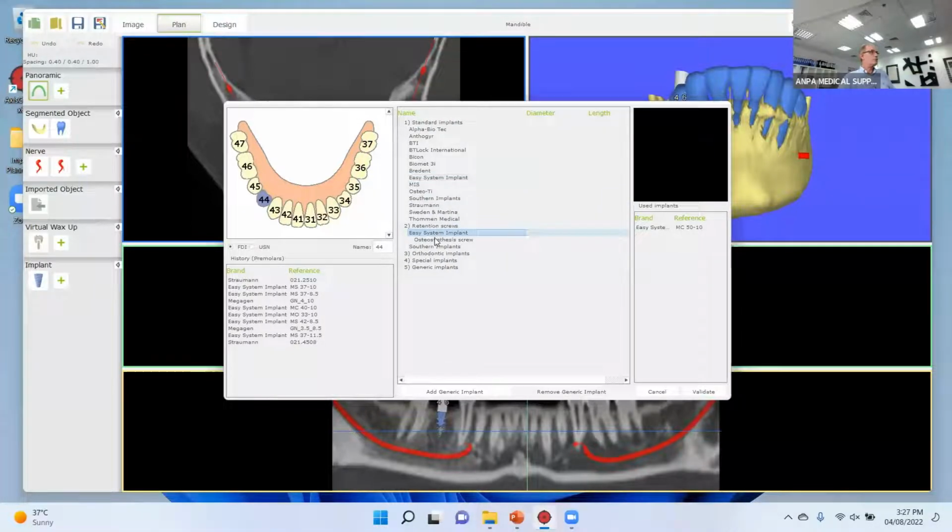So retention screws are important. So you have this kind of retention screw. Retention screws can allow you to stabilize the guide in the bone, okay? But not only do we have this, we also have pins that you can put through the guide inside the bone to stabilize the guide.